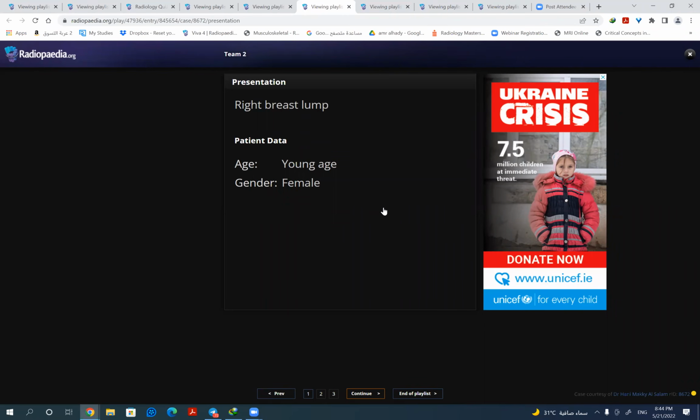Okay, thank you. Okay. So, young age female with right breast lump.